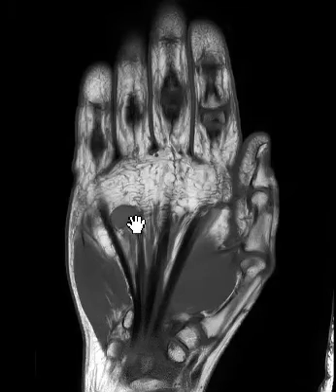Sometimes if they have a sliver or something else, you can actually see a little linear band in there, but I don't see that. But it still could be a tiny piece of hair or other little bit of debris that wouldn't show up on MRI in there. So it's either an epidermal inclusion cyst from the squamous epithelium embedded in there, or a foreign body granuloma.